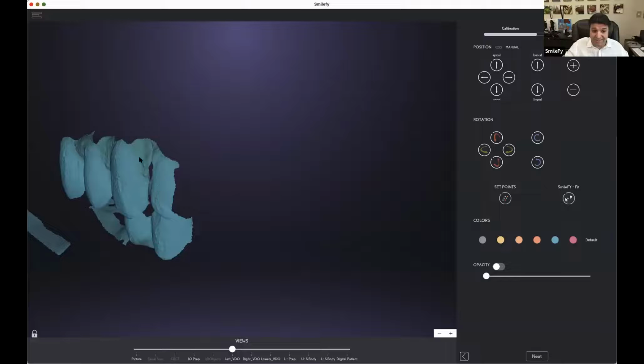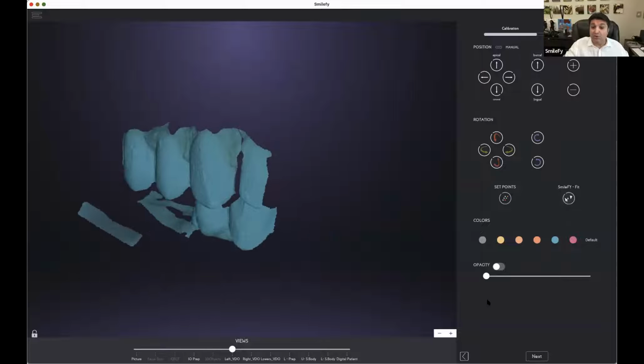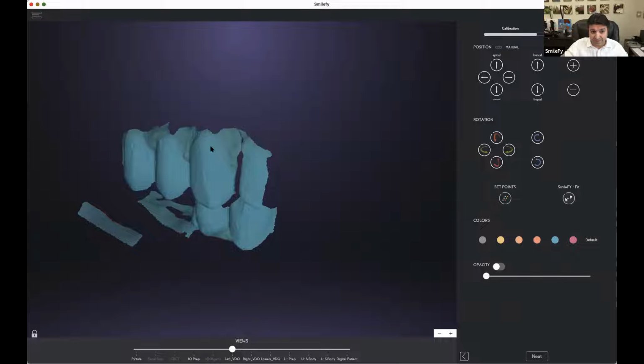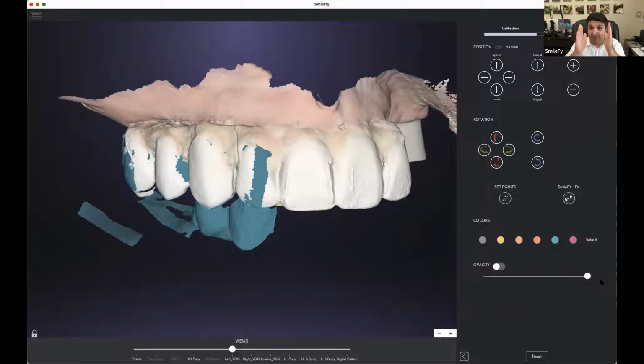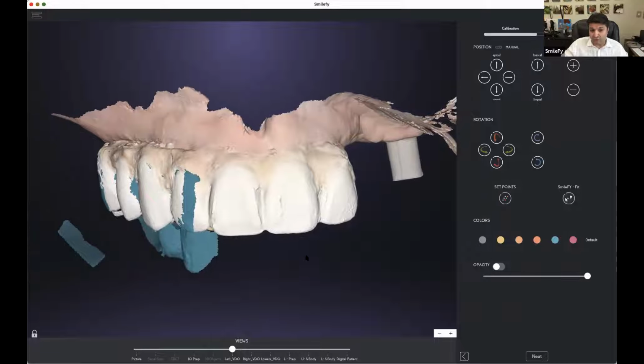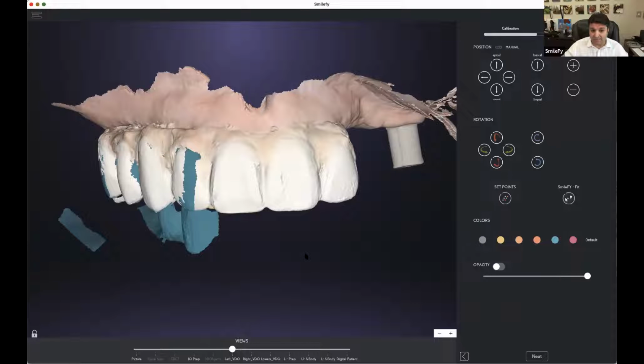You scan the new position, and that's the piece of the scan that we use to calibrate the upper jaw with these teeth, because the canine and the two premolars are the same, right? The lowers are in a different position with the new vertical dimension of occlusion. So that's very, very easy to define now the new vertical dimension of occlusion for our new design.